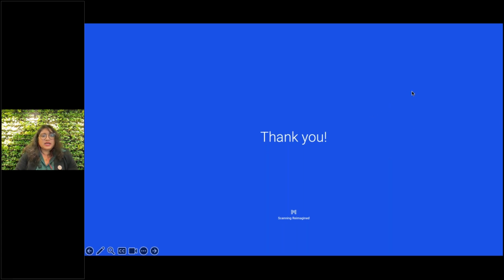For the last part, I want to actually just go over a small video. There is sometimes, but not always, we have to do GPU updates when there are new updates that come with Medit, right? So a lot of the doctors, a lot of users were not aware of how you get a GPU update done. So I'm going to just share a short video showing how you can do the graphic card update for NVIDIA graphic cards.